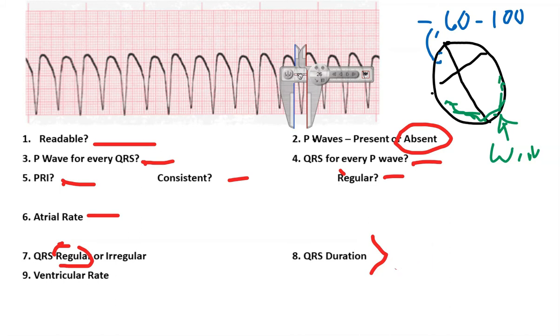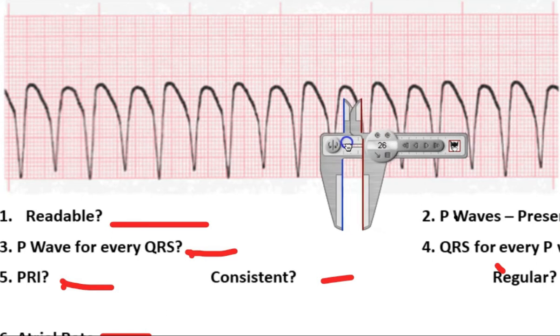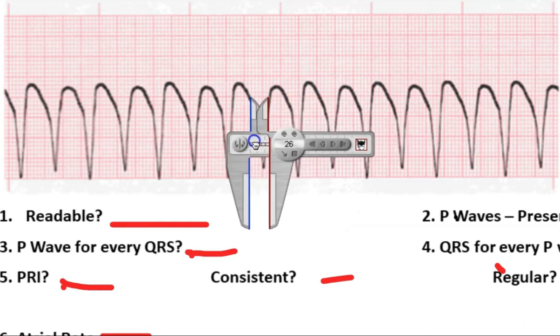So in this case, my QRS duration, just for following the rule, if it is greater than a 0.12, then we're actually saying that it's probably coming out of the ventricle. So that 0.12, in this case, we saw that it was a 0.20. So I want to make sure that it is actually wide. I'm just going to make sure that I am pretty consistent as I come down through. This is where I usually say this is the art of interpretation, because you want to measure it at the same spot as frequently as possible. One thing I can point out is right here, I'm pretty much following along this nice little heavy line with the graph paper behind here for the ECG.